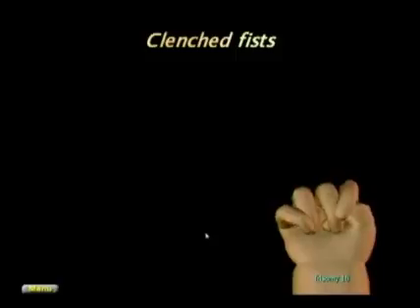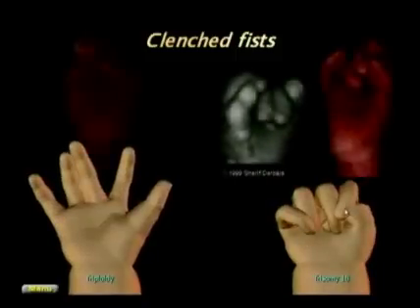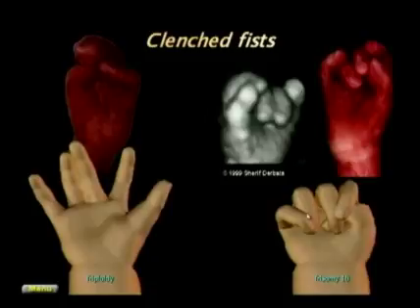There are two clenched fists you really should know. One is trisomy 18, with overlapping of the third digit by the second digit and the fourth digit by the fifth digit. This is the 3D ultrasound rendering, and this is the pathology specimen. This is extremely typical of trisomy 18. The other clenched fist is the one of triploidy, in which there is a cutaneous syndactyly of the third and fourth digit.